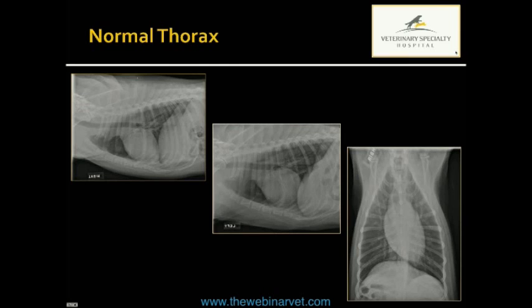But certainly you want to make sure your exposure is appropriate, that you've included everything anatomically that you need. So definitely you want to have the thoracic inlet, and a little bit cranial to it would be ideal. So that's the very minimum here, but we'd like to be a little bit more cranial. And then caudally, if you've included the entirety of the liver, you probably have the caudal extent of the lung field. Some people will use this caudodorsal margin. You just have to be a little bit cautious because the lung field can extend quite a bit caudal. So just pay attention to the pulmonary vasculature, and that's going to tell you really where the limit of the caudal lung field is.